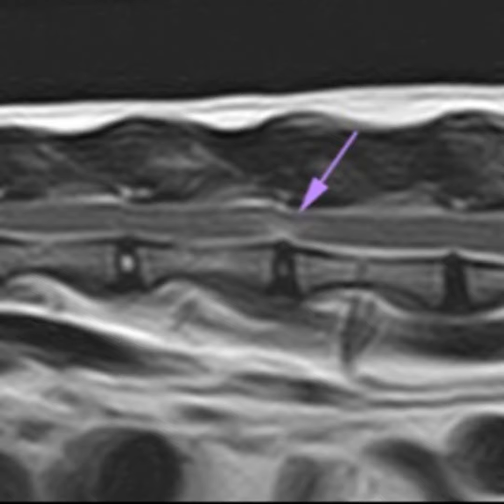It's a retrospective study, and we collected cases from 2008 to 2020, and cats were included if a complete medical evaluation, including both a physical and neurological examination, was performed, if they had a spinal cord neurolocalization, and a diagnosis of disc herniation by MRI. For each cat, we recorded the following information: signalment, onset of clinical signs, type and severity of neurological deficits, presence of spinal pain, and any traumatic event preceding the onset of clinical signs.